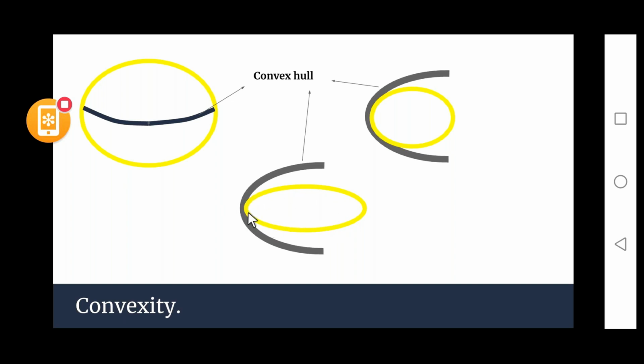This is just like a steep cornea, or a keratoconic cornea. In this region there is less touch with the convex hull, so it means this is a more convex area. So the x and y coordinates of the centroid are nothing but the steep area from which the convex hull starts on the cornea.